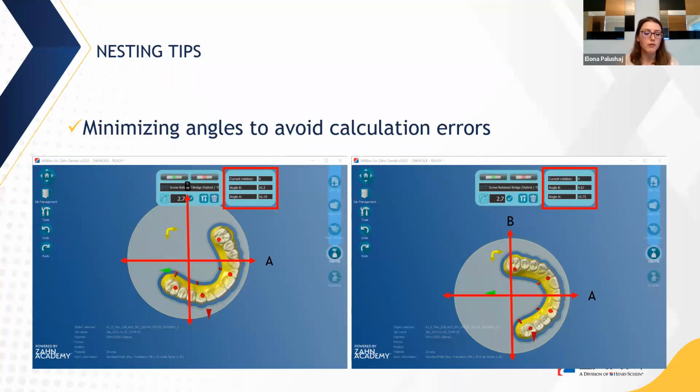So the way that the axes work on a Roland, and that will be different per mill, and of course the position will change depending on that, is the A-axis is the one where the disc flips 180, right? So while it has a 30-degree limit, it really doesn't have a limit because it flips 180. So a lot more lenient on that. You can go above on the A-axis. The B-axis, on the other hand, is the unit moving back and forth, and that definitely has limitations. So you can't go very far.